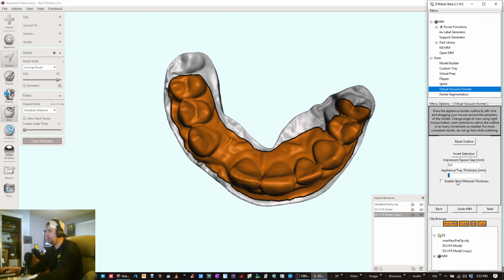So I'm going to say it doesn't really matter here, right? I mean, we're going to use this once, throw it away. We probably want more thickness if it means that it's going to have a better chance of printing successfully and also not tearing on us and also going through the whole clinical environment. So we don't really need to get this too thin. I think 2 millimeters is just fine. Might be a little thick.